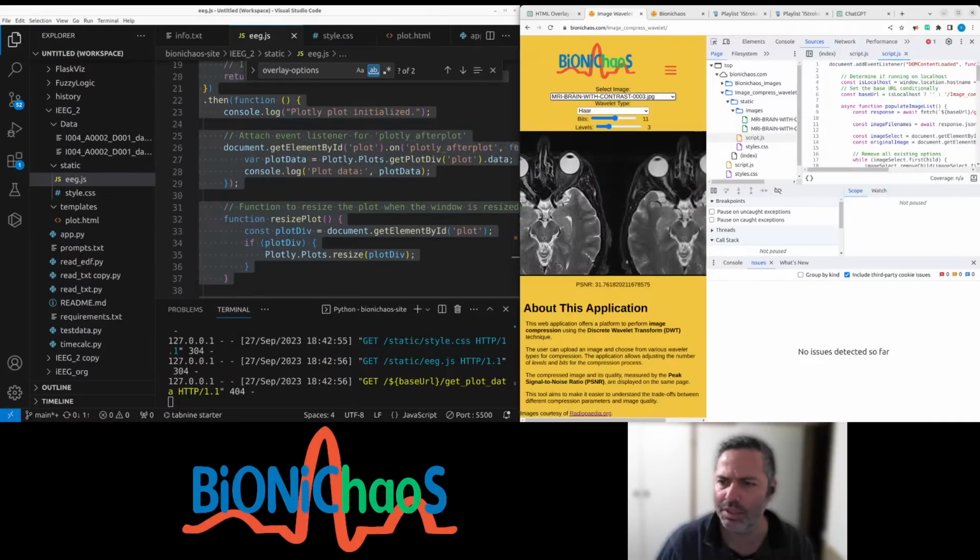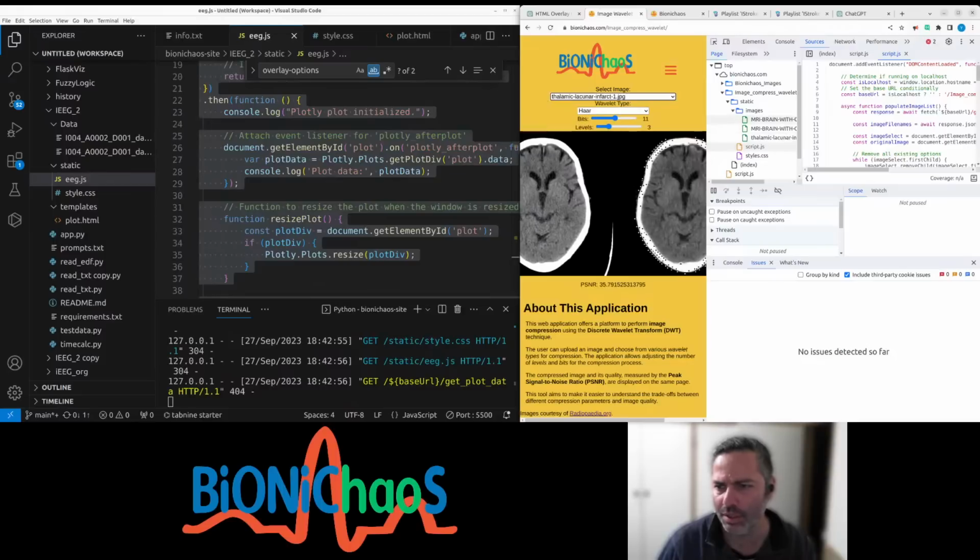So if you select the number, once you select them, you'll see them here. The images are available in the public domain. Those are Creative Commons. Most of them are from radiopedia.org. You can get like millions of MRI and CT scan images from there.